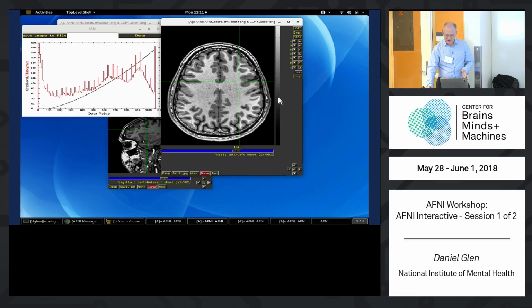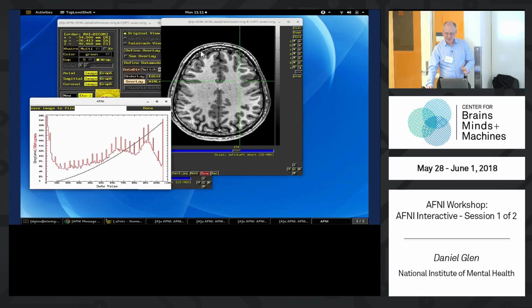How do you find hidden menus? Well, on Linux systems, it's kind of hard. On the Mac, it's a little bit easier because as you move your cursor, you'll see the arrow change color. So if you have a Mac, you probably see it change to yellow or something, and the tilt changes a little bit. That's a clue that there's a hidden menu behind that. We have these little Easter eggs of menus. There's so much stuff to put in, so many features inside, we have to hide it someplace because we can't show you everything at once.